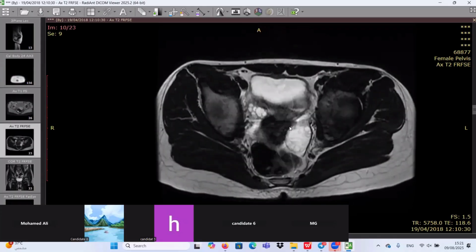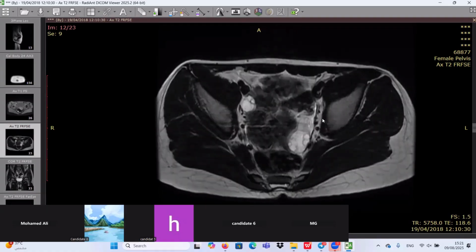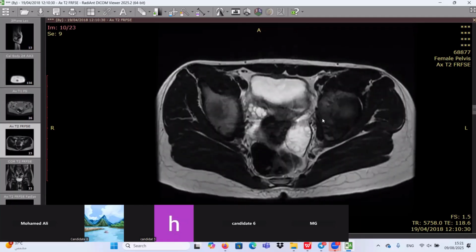of the uterus. But as you said, we have here highly suspicious left ovarian torsion, and this case was operated at once at the time, and alhamdulillah, thanks to God, it was still viable. And as you mentioned, we don't have any hemorrhagic patches in the left ovary, so we don't have any signs of hemorrhagic infarction of the ovary. And alhamdulillah, the ovary was fixed successfully, and was saved totally. So this case is left ovarian torsion.